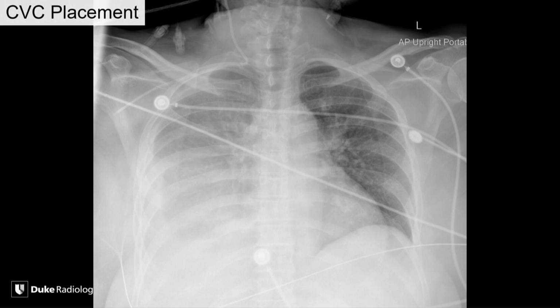What about this one? This patient had a catheter placed in the field. They thought they were placing an IJ catheter. Patient had a large right effusion. Clearly, the catheter is taking a weird position. I called up the ER, said, this catheter doesn't look like it's in a normal position. They said, yeah, we know, we've already checked it. We put a pulse waveform on there, it's arterial, we're getting ready to pull it.